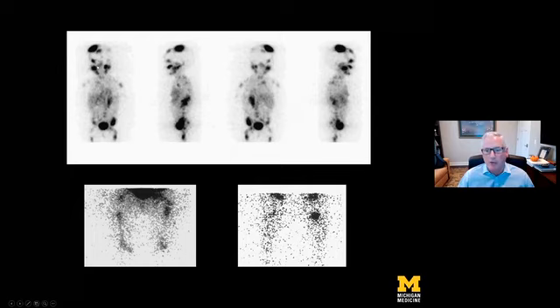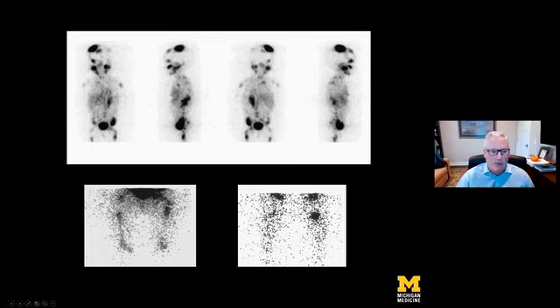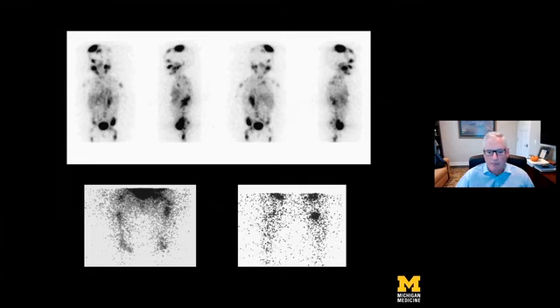There is discussion about how much marrow involvement is too much, and then you have to treat them more as stage M versus MS. But again, we can see the bony involvement. We shouldn't have this kind of uptake on MIBG, topic for another day. But again, for MS disease, you can have MIBG scan positive, but you should have bone scan negative if you've done both.